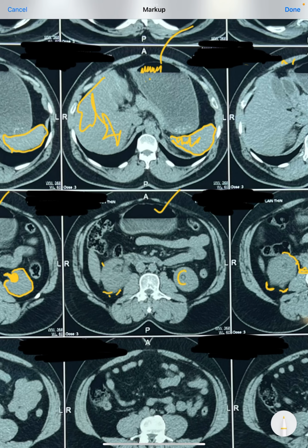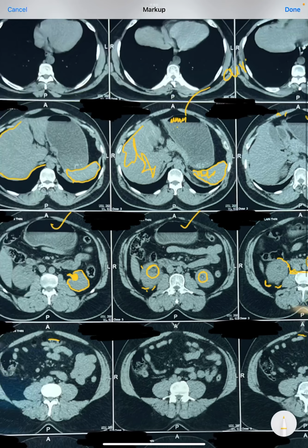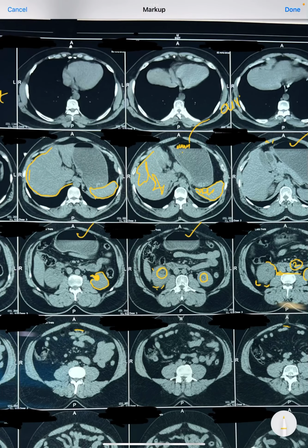See the pelvis. It is very small, and compared to here, it is large. And why is it large? It can be large only because of the hydronephrosis. What is hydronephrosis? Kidney, and there is ureter. Normally, this ureter is very small or it is not dilated. So you will see this pelvis in its normal size.